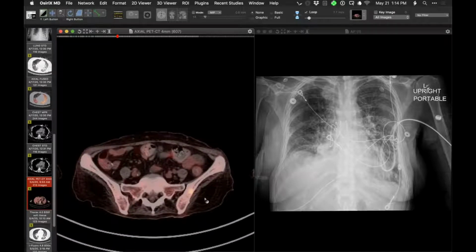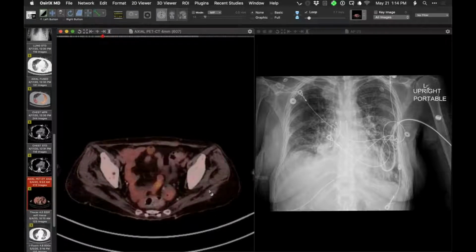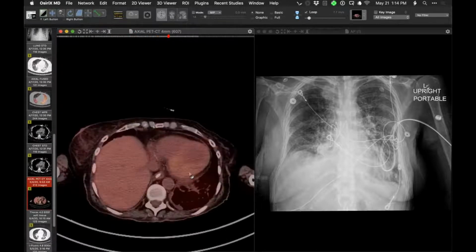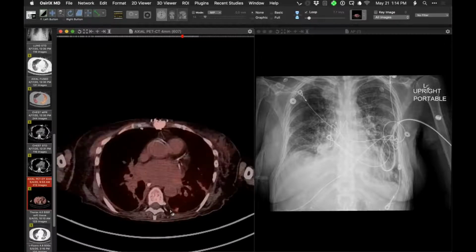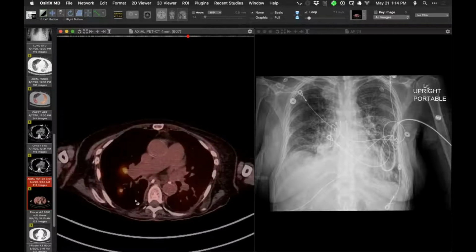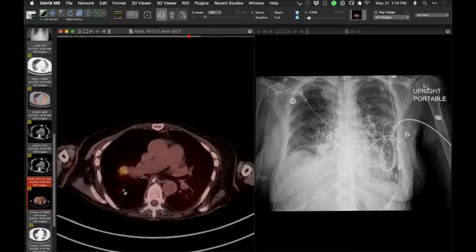It showed a bone lesion. There was an abnormality described in relation to a segment of bowel down here, but then pretty impressive findings in the chest. So we have lots of nodules, largest in the left lower lobe, there's one in the right lower lobe. There are more nodules elsewhere, some in the periphery, subpleural. This is either a nodule or lymph node involvement.